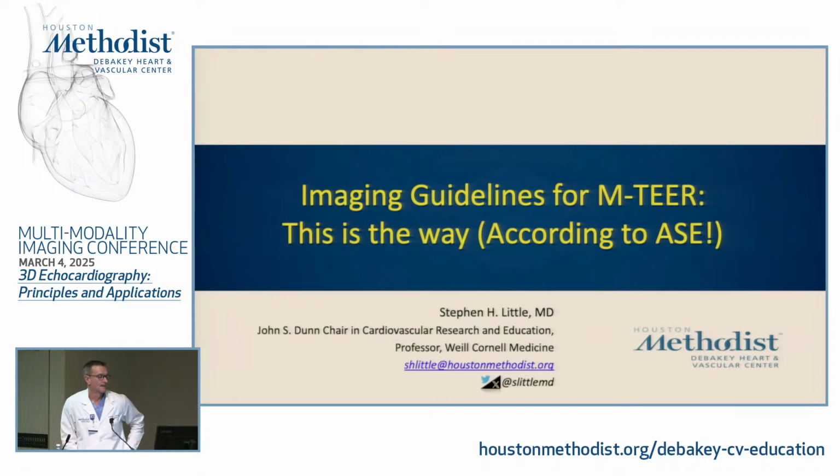Okay. So the next short talk I want to give you is kind of applying this kind of stuff. This is a protocol we're working on, but it's sort of consistent with this message: how do we incorporate 3D into something intentional? So I'll just quickly show you a guideline we're working on for the performance of mitral valve TEER.